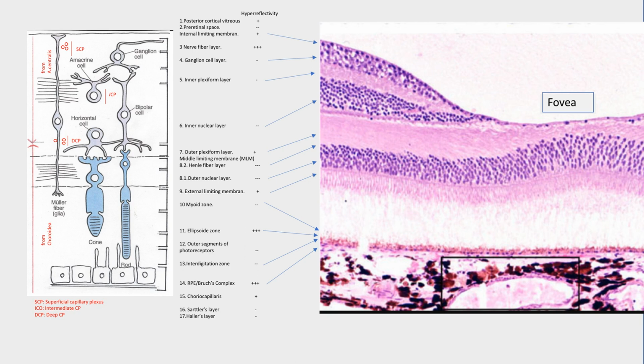In the macular region, there are no rods, but only cones, with a density such that the outer nuclear layer reaches its maximum thickness. The outer limiting membrane, in the absence of the other layers in the central area, forms a sort of depression called fovea externa.